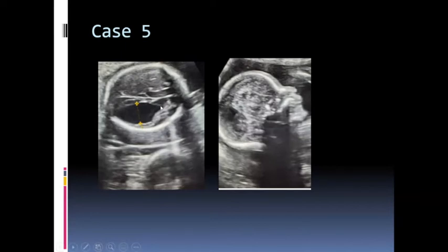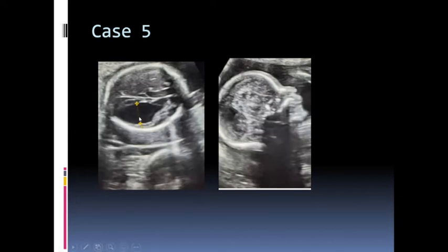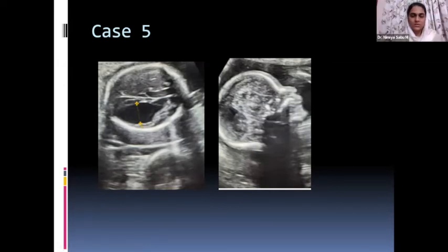What is this called? Colpocephaly. Corpus callosum agenesis. Yeah. If you see this, we should look for corpus callosum agenesis, and also there will be an absent septum pellucidum in such cases. Usually in a mid-sagittal view, you will be able to see a hypoechoic structure, the corpus callosum. Here we're not seeing that. So it's a case of corpus callosum agenesis.